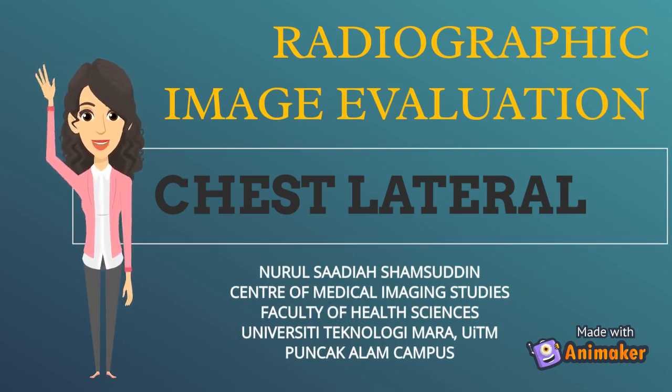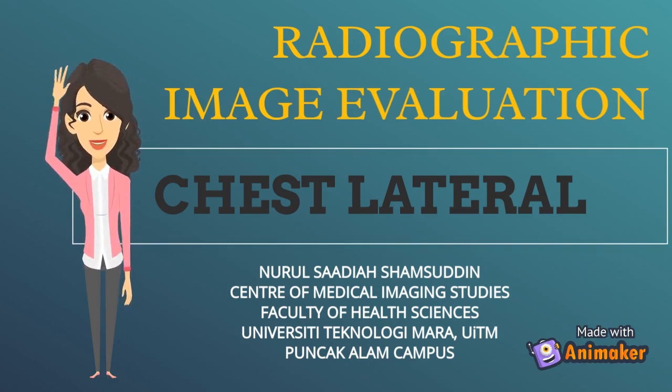Today's topic is image evaluation of chest and lateral projection. In this video, I will focus on evaluating the positioning aspect of the image. So, let's get started.